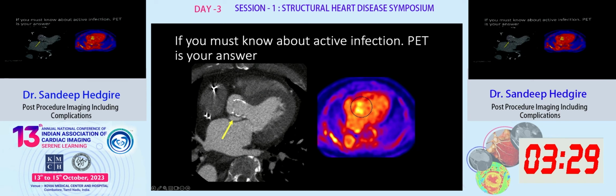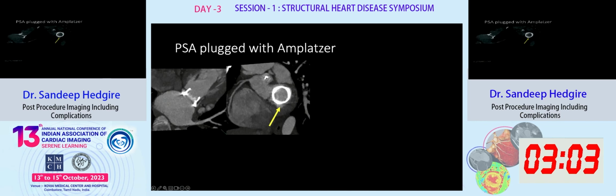And here is an example. So these two scans are done 6 months apart, and when we did the follow-up PET after 6 months, the patient was still having episodes of fever, and on PET, this area did light up. Please note that if you are doing this, particularly for heart valves, PET requires special preparation because you want to suppress the myocardial FDG uptake. So we give a high-fat diet for PET when we're doing this.